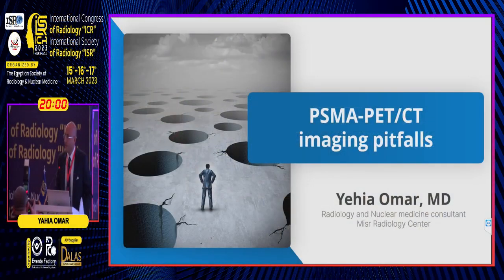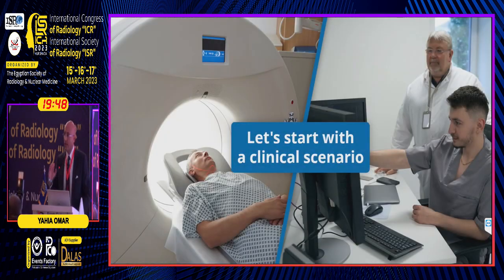Good morning. It's my pleasure to be with you today in the International Congress of Radiology. I'm going to present PSMA-PET CT imaging pitfalls. It will be more case-based oriented. I hope we can have some interaction together. So I will start straight away with a real case scenario.